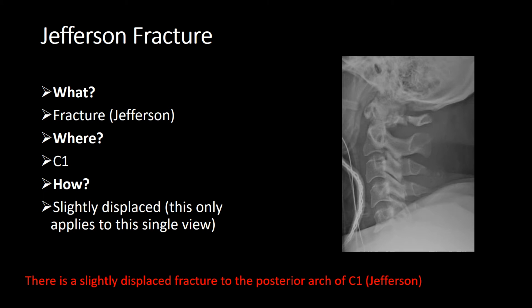However, in the exam scenario, I don't want you to focus on what you can't see. We're not expecting you to report on something you cannot see. We want you to focus on the area of interest that has been included on your imaging. So in the exam context, don't worry if you can't see the entire cervical spine. Clinically, this is inadequate and you would need to repeat.